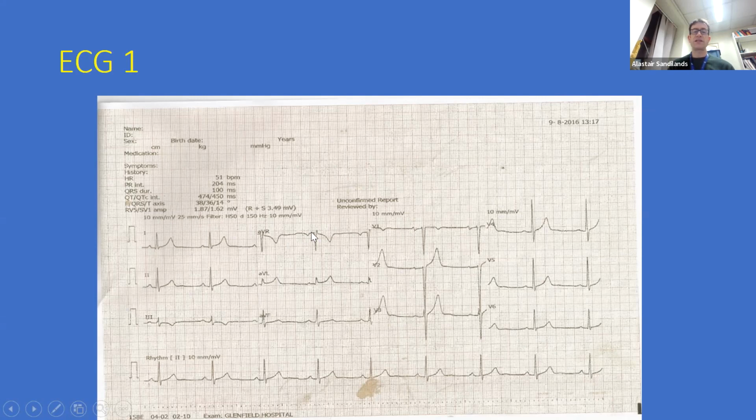aVR, everything is negative. Everything's going away from aVR, so it's all negative, that's fine. V1 is a little negative T-wave there. Yep, that's all fine, we're not worried about that. Is there any ST elevation? If you look here, it's a very subtle change. Yes, even there, this little bit, but it's a very small amount of change.